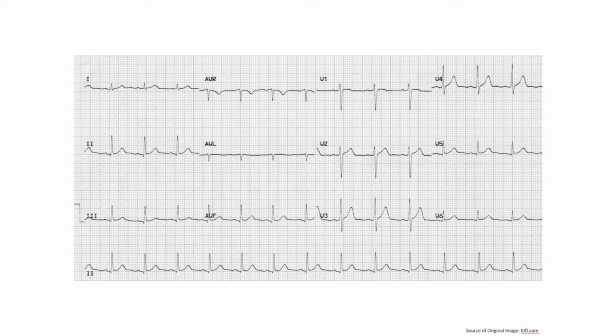Using the information we've learned, let's try and estimate the frequency of QRS complexes in this EKG. So we have one QRS complex there, one there, one there, one there, and so on and so forth. And notice how they're pretty much all happening fairly regularly.